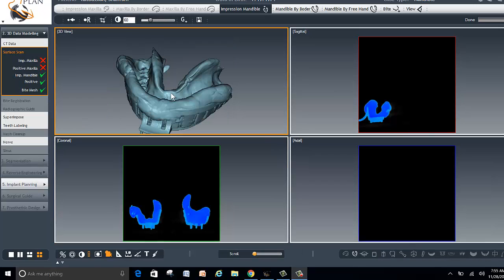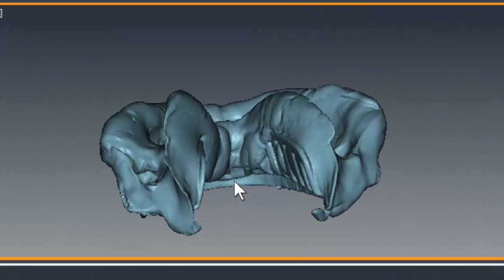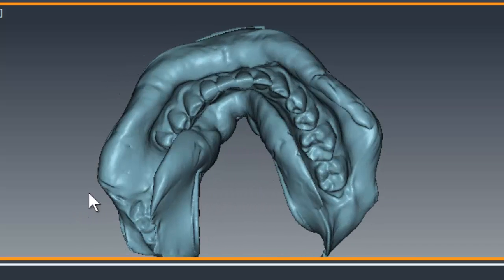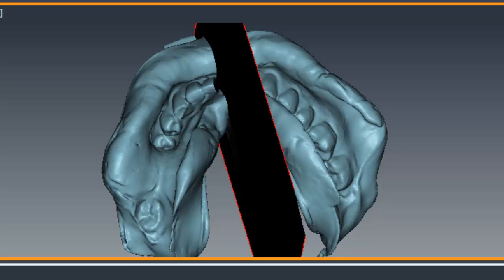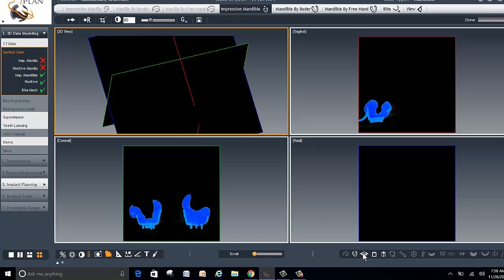This portion of the treatment plan shows what we do with the polyvinyl impression that was taken. If you do not have an intraoral scanner that can take STL data directly in the patient's mouth, you can take PVS impressions and scan them through the cone beam scan, and the software can render it in 3D. This is a very accurate way of rendering it, because here we can look at it as a sagittal slice, axial slice, and coronal slice.